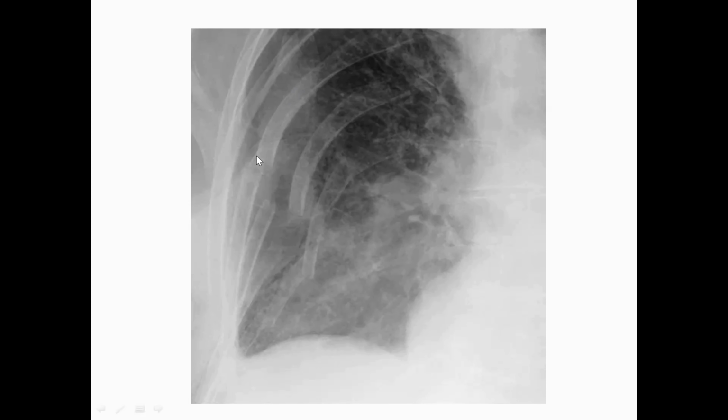Look, this is a discontinuity. If you see a discontinuity or irregularity, it means it will be a fracture. So this is also a slightly displaced fracture. This is another clear displaced posterior fracture. This one is undisplaced. So suppose if this was the only fracture, how are you going to know? Just follow the continuity of the lining of the rib. You will see discontinuity and irregularity, and you will pick up the fracture.